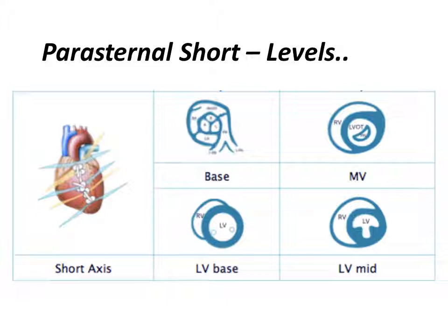And when you tilt it up, and I'm not sure whether you are able to imagine that looking at this picture, you are actually sectioning or cutting the heart at the level of the great vessels. So you see the aorta, and you cut the aorta right at the level of the aortic valve. So you see a view in which you are able to see all three leaflets of the aortic valve, the sort of Mercedes-Benz type of sign, and you see the centrality of the aorta as you see all the chambers surrounding it. And we'll have a good look at it in the next few slides.